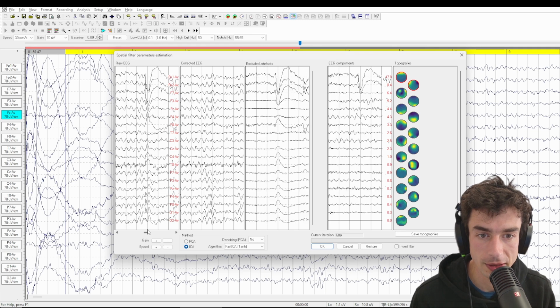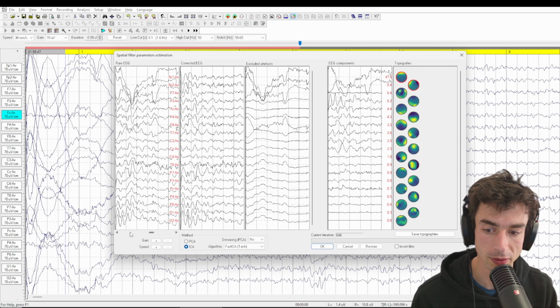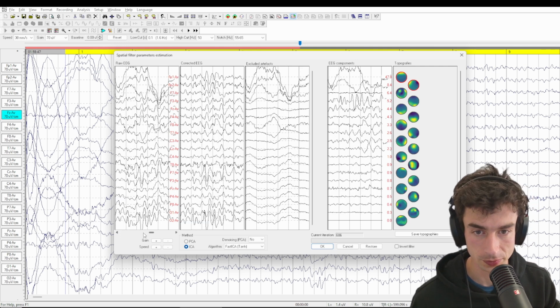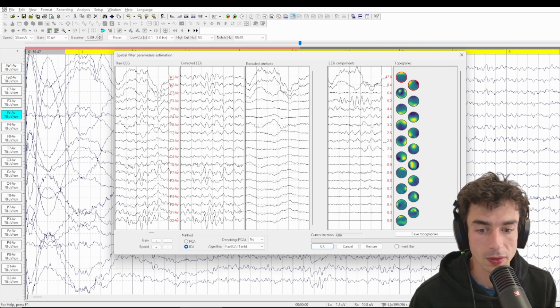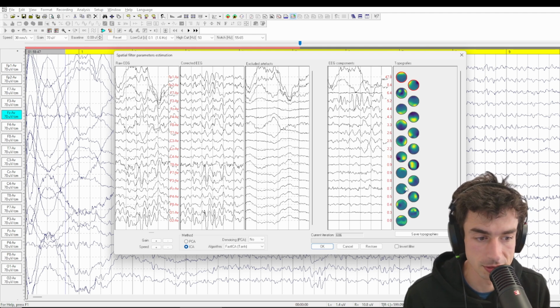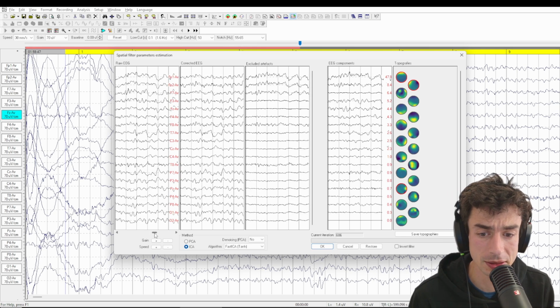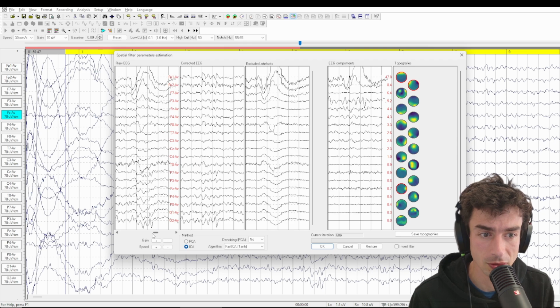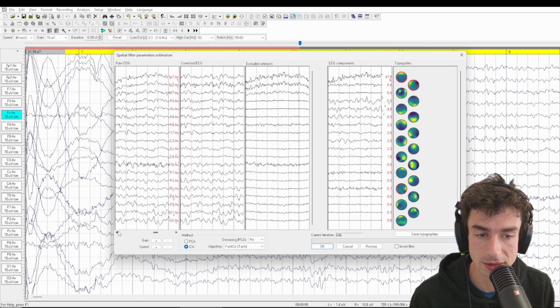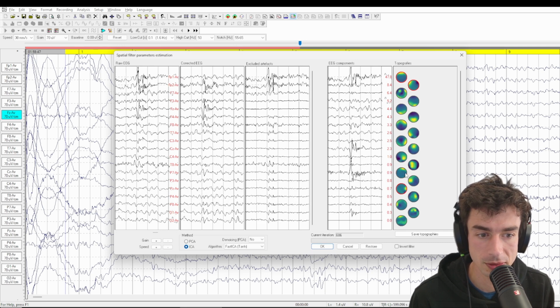So whenever I do ICA, I like to remove as little as possible while still getting rid of anything that is non-cortical. And the last thing I really want to try to get out is just this T8 muscle activity. That may be all we need to remove in order to be done here, because the instances of muscle tension that we saw were quite isolated, and I'm not super confident that we're going to get great topographies for them.